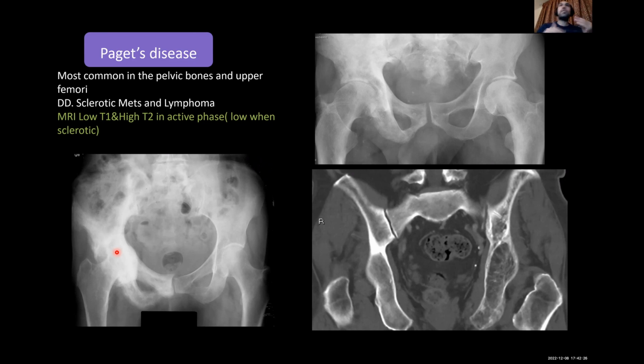You cannot say this is osteoporosis. Why osteoporosis? Because it appears apparently lucent. Why lucent? Lucent compared to which? When you say osteoporosis, it means thinning of the cortex like that. You have to have your reference. You have to give some measurements, not just spit it out. I'm sorry for the word. Spit it out: this is lucent, this is osteoporosis. These are not scientific terms. You can be right sometimes, but this is not a scientific term.